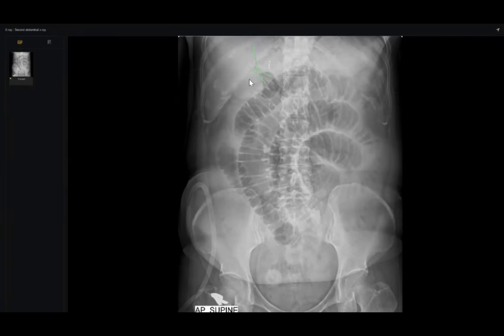And look here. Number two, you find a stone here or a radiolucent stone, and dilated bowel. Search here for any lucency and tell the examiner there are linear lucencies, branching lucencies toward the center of the liver, always representing pneumobilia. Why? This looks like a picture of gallstone ileus.